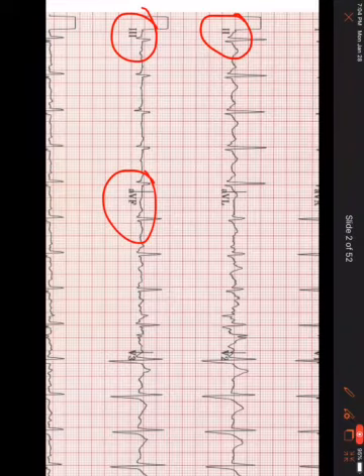Ischemia is important to note, but in the very beginning, as soon as I capture that 12 lead and I'm in the back of the medic unit, I look for ST elevation immediately across all my leads. Then, once I can rule in or rule out a STEMI, an ST segment elevated myocardial infarction, I will then go back and look a little bit more detailed to pick up on any ischemia or axis deviation or anything like that I need to be aware of.